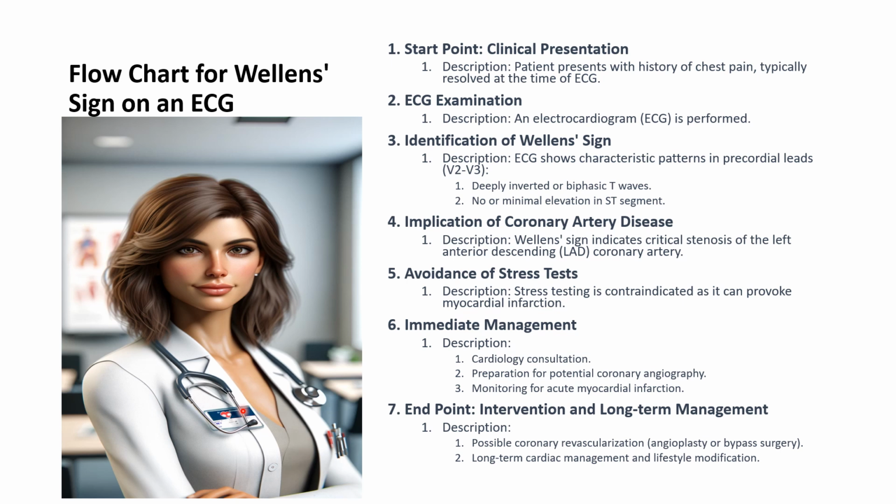Implication of coronary artery disease. Wellens sign indicates critical stenosis of the left anterior descending, LAD, coronary artery. Avoidance of stress tests. Stress testing is contraindicated as it can provoke myocardial infarction. Immediate management. Cardiology consultation. Preparation for potential coronary angiography. Monitoring for acute myocardial infarction.